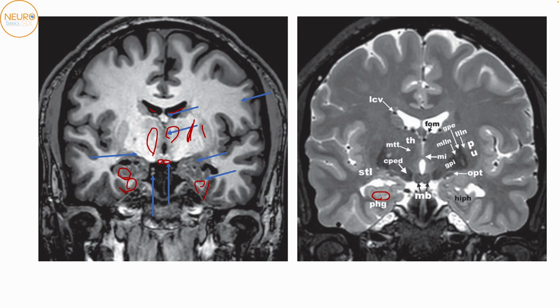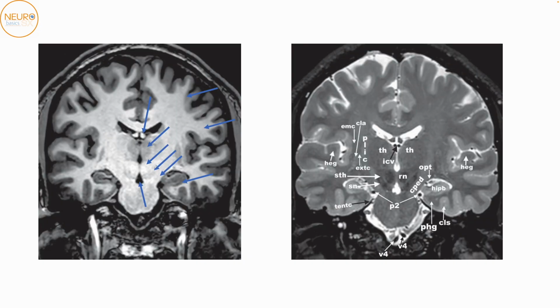There are two structures you can see within the suprasellar cistern, one here and one here. The inferior one corresponds to this hypointensity on the T2 image. So that's most likely the PCOM. And superiorly, you have the third nerve over here. Okay. So the more posterior we go, things get slightly more obvious. You get the brainstem. This is the beginning of the aqueduct. This here is the fornix over here. This is the thalamus.